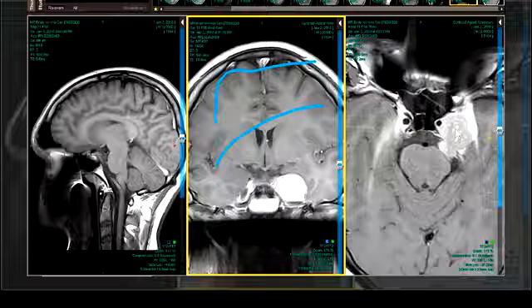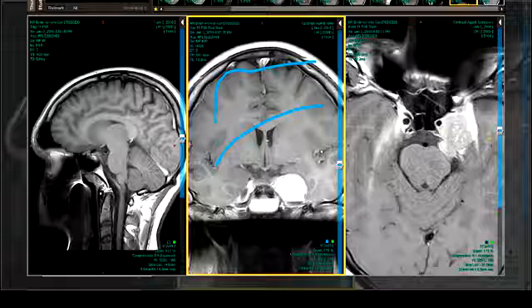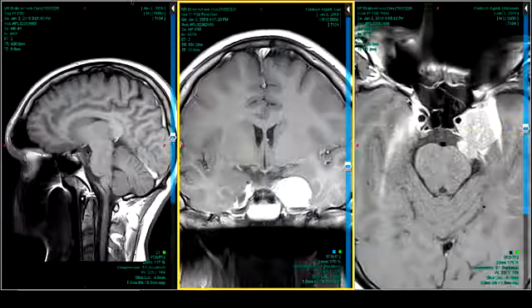You can see there's a fair amount of overlap in the appearance of a meningioma and a schwannoma. I think I probably had most of you talked into it. I was selling it really hard.